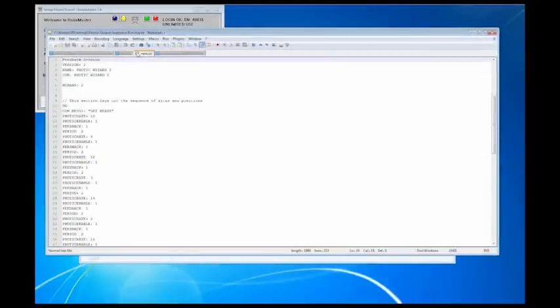So as you can see, I have a bunch of different files open up here. And the reason I have them all open is because I want to go over some of the different features and functions that Session Wizard can do, go over how they're getting controlled right here with you guys, and some of the different things you can do to them to possibly make them easier for you.